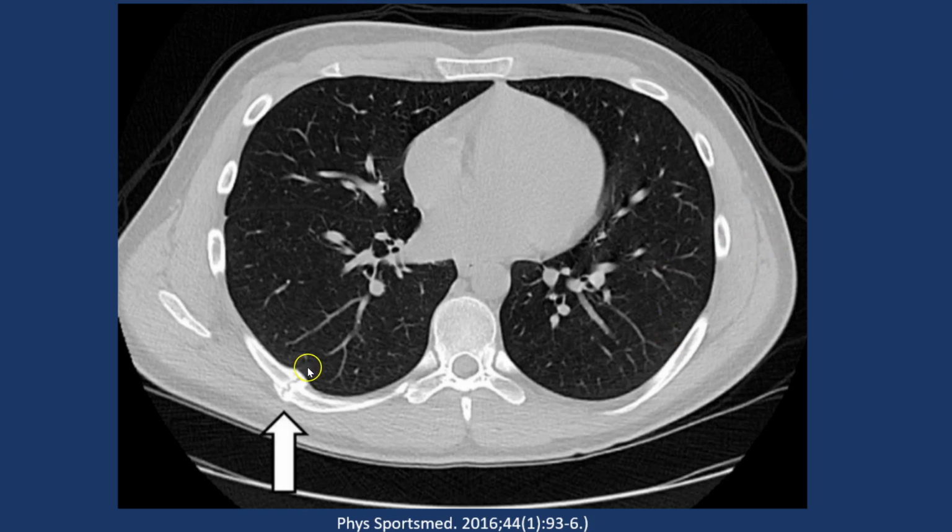CT will be a fancy looking x-ray. You'll see better indication or demarcation of the fracture line with clearly demarcated callus. You will not appreciate the adjacent edema in the soft tissues or the bone. However, I think the diagnosis would be pretty clear off of a CT. It's very sensitive compared to radiography.